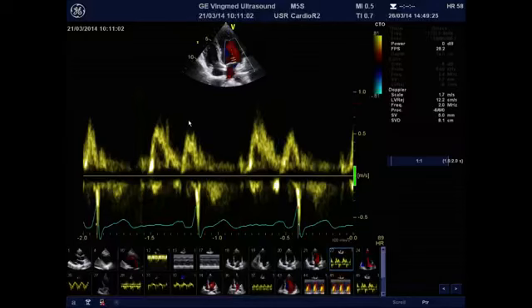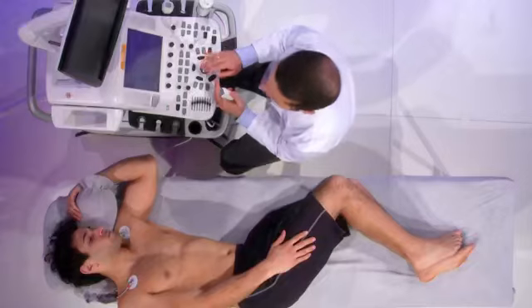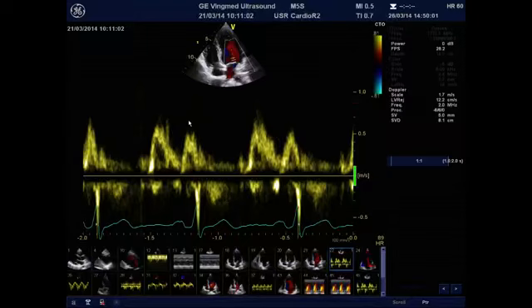Later on, the second stage of diastolic dysfunction, when there are also increased filling pressures on top of impaired relaxation, will lead to the so-called pseudonormal pattern, whereby again the E wave will be brought back to normal, and this is why it is called pseudonormal. And in the very late stages, the third degree of diastolic dysfunction is the so-called restrictive filling pattern, whereby we will record a very tall E wave with a small diminutive A wave, and so an increase in the E over A ratio.